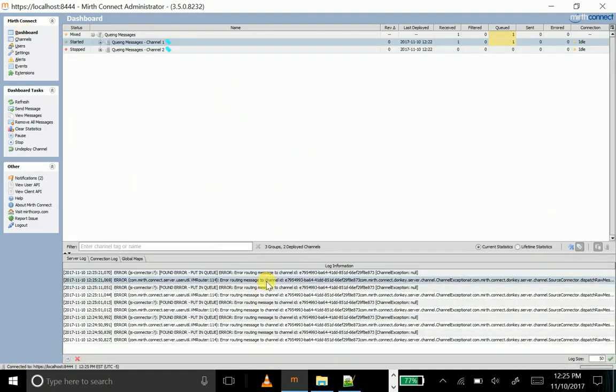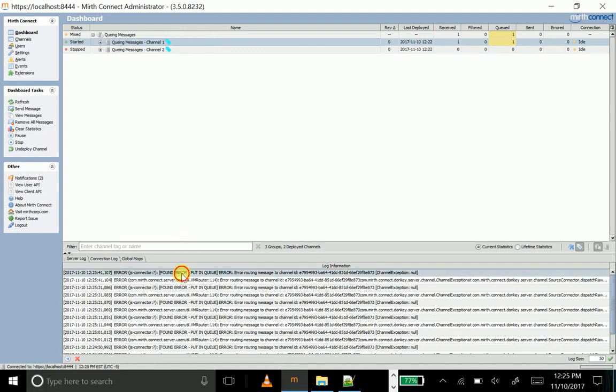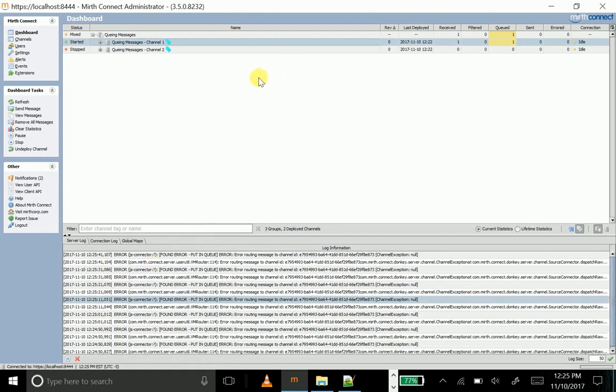And it'll keep going until, Mirth will keep checking every, more than a couple seconds, right? Every like 5 to 10 seconds, it looks like. Mirth keeps checking to see if channel number 2 is up. So basically, you can see by all the logger errors, it just keeps running through that JavaScript code over and over again until it can process the message successfully.